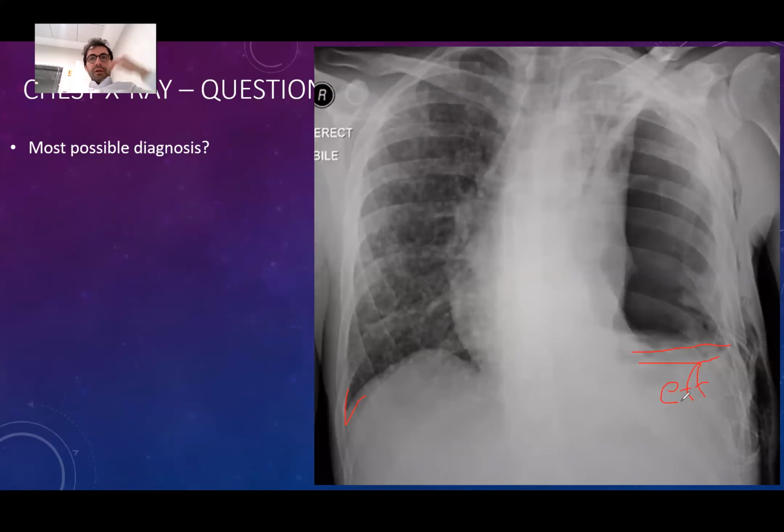I don't stop, I continue. I started looking at the ribs. The ribs are going well here. And somebody's microphone is open. Yunus Emre. Okay. I'm looking at the other ribs because I see air in the soft tissues. I'm looking for rib fractures, and I couldn't find any. So I started looking at the lung areas.